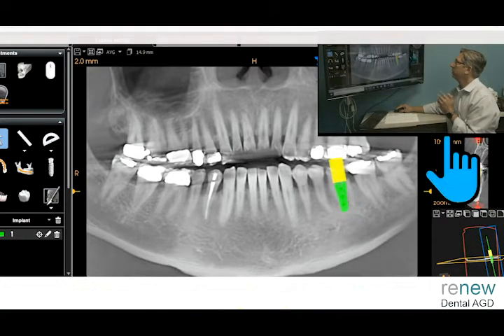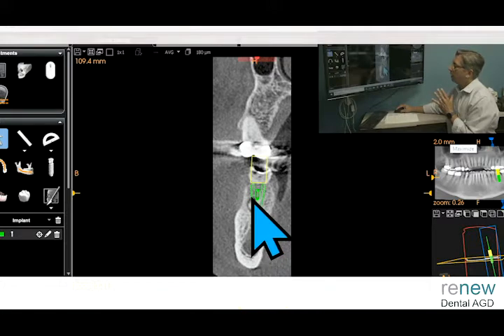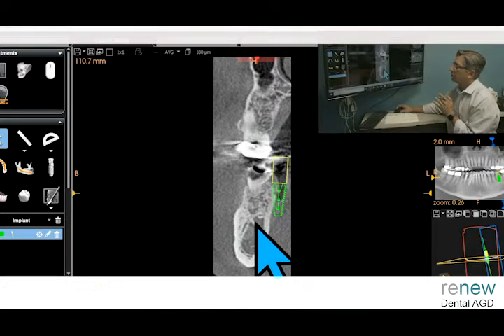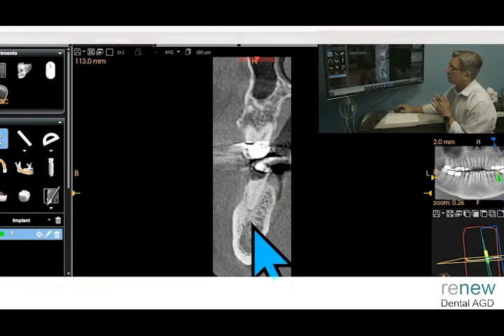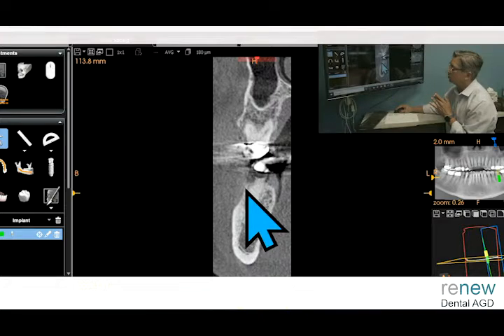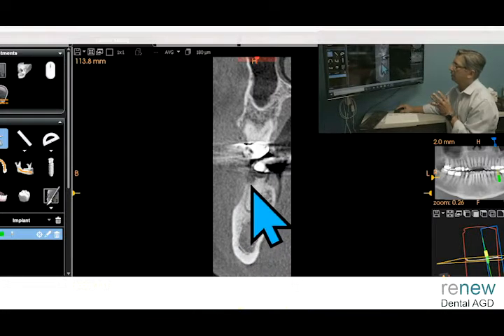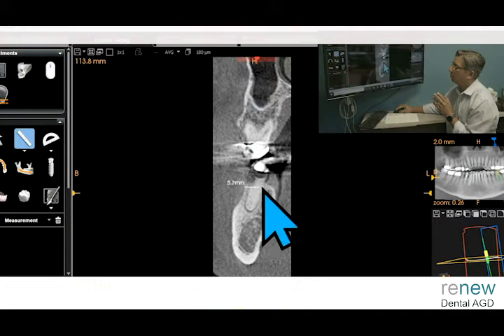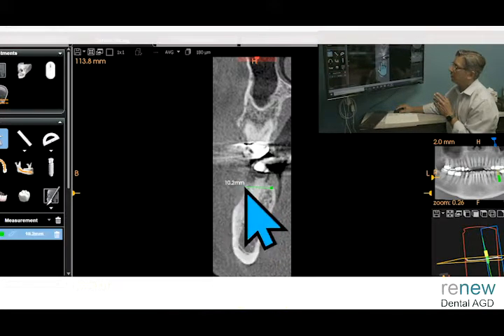So looking at the side here too, we have a little bit of facial bone. So here's where you get predictive value by doing a graft first. As we look at the tooth structure here, you can see that little outline. That's a ligament space, but then you have this really kind of hard bone here. Many times this dissolves away and your graft can help hold it here, but if it doesn't, it will probably melt that corner off.